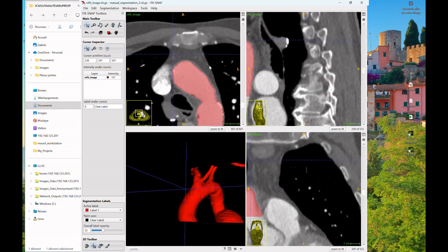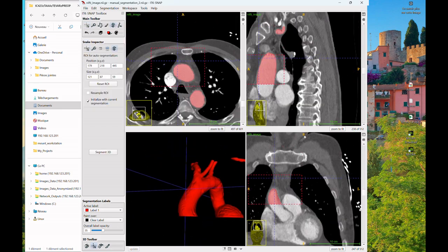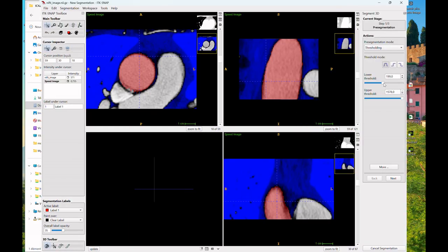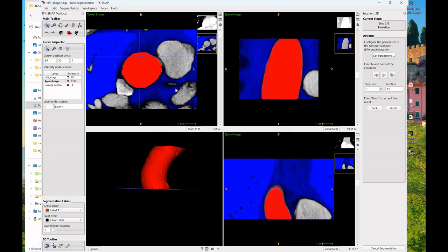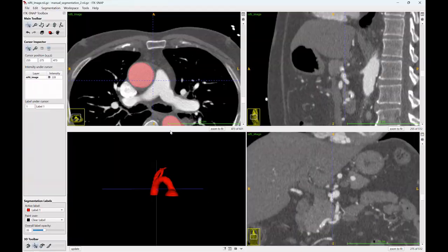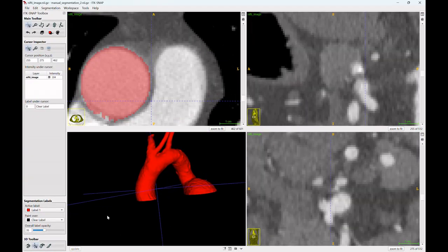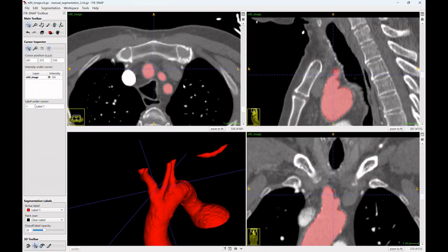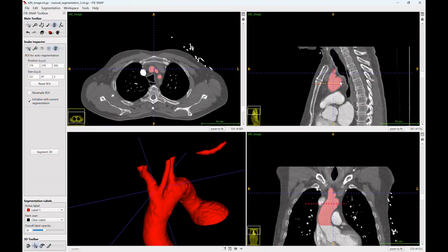Once the main segmentation is complete, the next phase consists of regularizing the contours. The regularization begins on the ascending portion of the aorta. Since this area is relatively homogeneous, it is recommended to increase the smoothing force parameter in order to obtain a smoother and more consistent result.